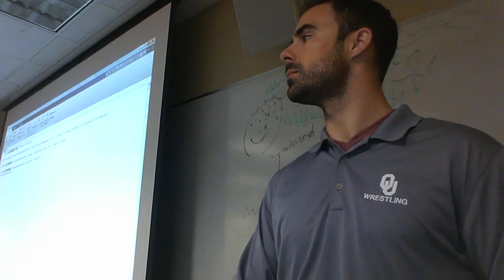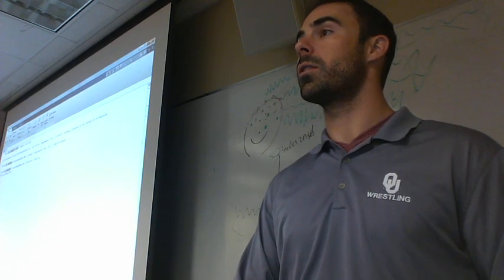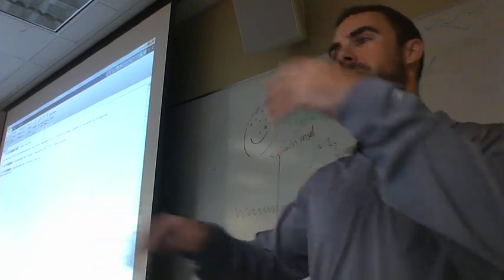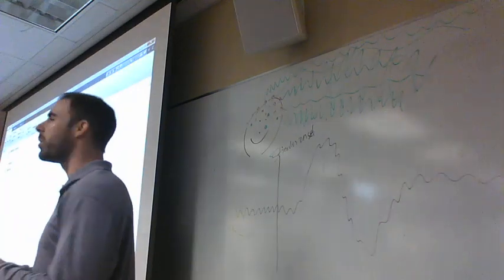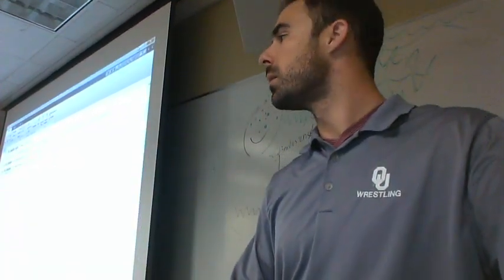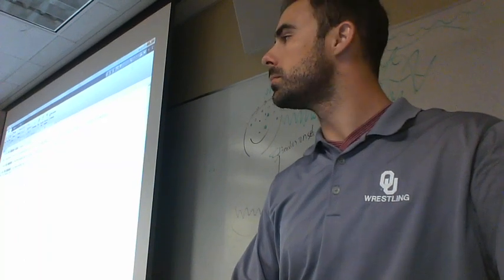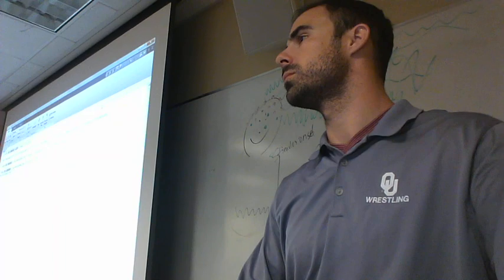See what I mean? Isn't that helpful? All right, so we're doing this at a very basic level, so as we get more ramped up, we'll revisit this and work on it, but I think it's a good thing to introduce from the get-go. I like to, but you don't need to. As long as it's green, you're clean.